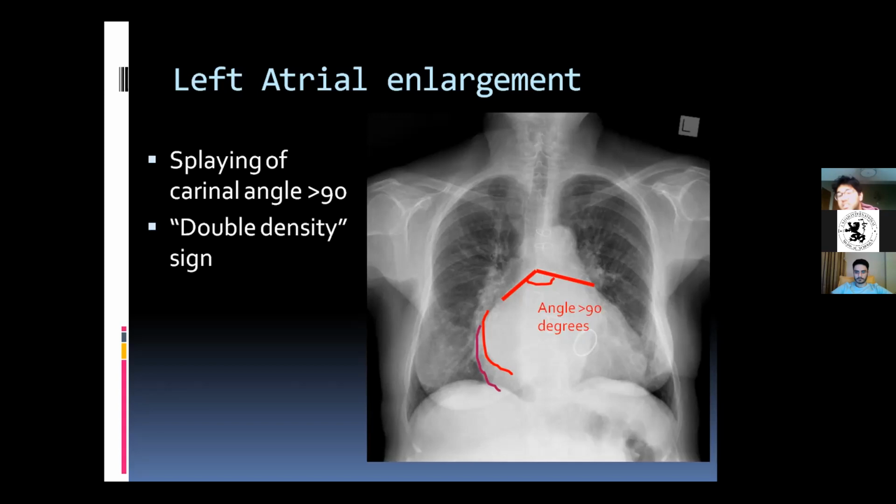It'll inevitably, remember, any kind of heart failure, sided heart failure will lead to the other sided heart failure as well. So you're right, it can be big as well. But in this case, the right atrium is pushed because of the left atrium. Yeah, there is mitral stenosis.